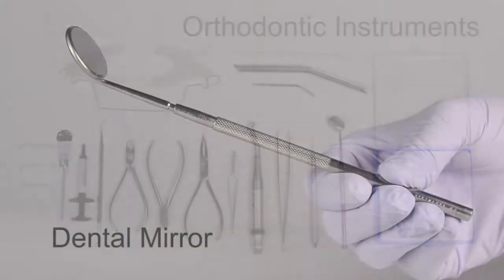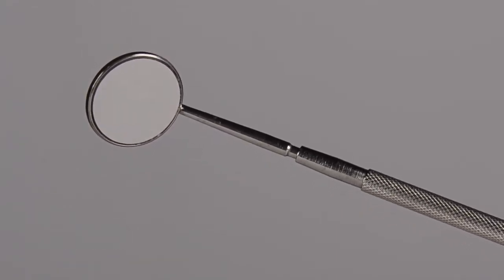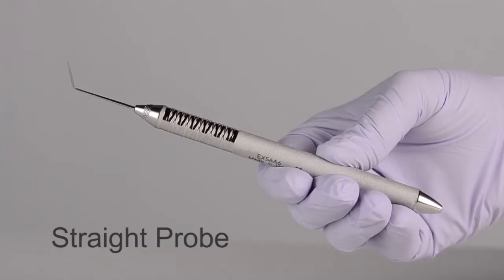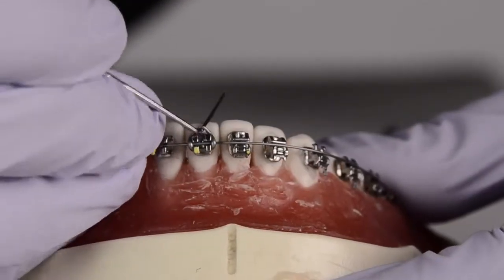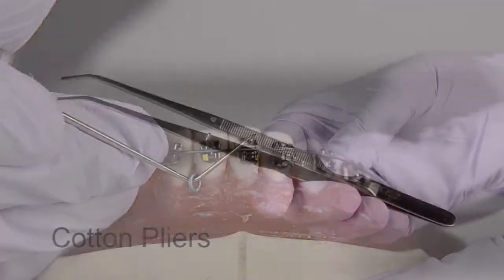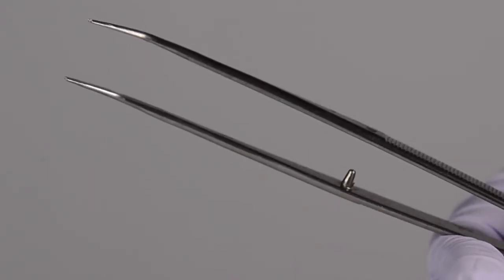patient. A dental mirror, while not specific to orthodontics, is used for visualization and retraction during procedures. A straight probe aids in the positioning of orthodontic brackets and is used in the removal of excess composite from around brackets, as well as for the removal of elastomeric ligatures from brackets. Cotton pliers are used for the placement of cotton rolls for isolation, as well as for the retrieval of small objects intraorally.